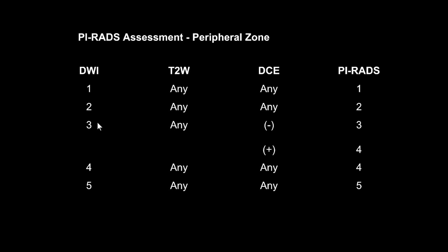What that means is that you have mild or moderate hypointensity on the ADC map and isointensity to mild hyperintensity as you go from a B value of 0 to 400 to 800 to 1200 to 1600. So it goes up, but not as much as it goes up here. It doesn't smack you right in the nose.